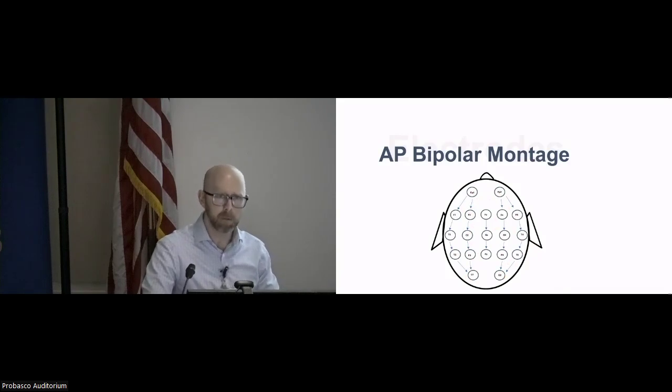But there are times where other montages are really, really beneficial. You might think about it: if you're near the end of the head here, like in the occipital region, it might be really useful to compare this electrode to that electrode to get a better feel for where we are. So there are other montages.